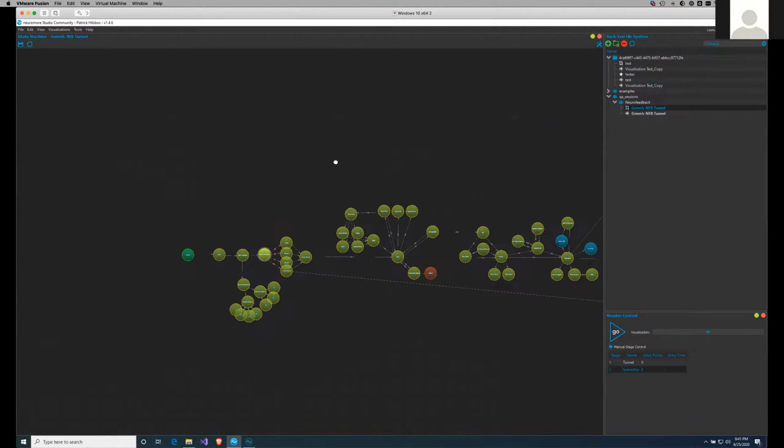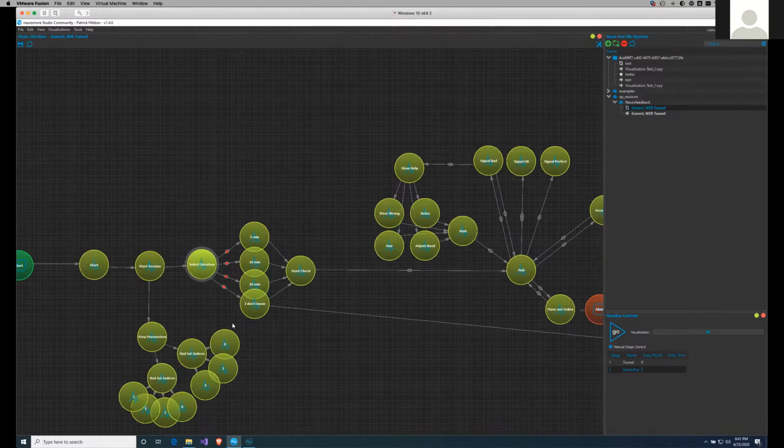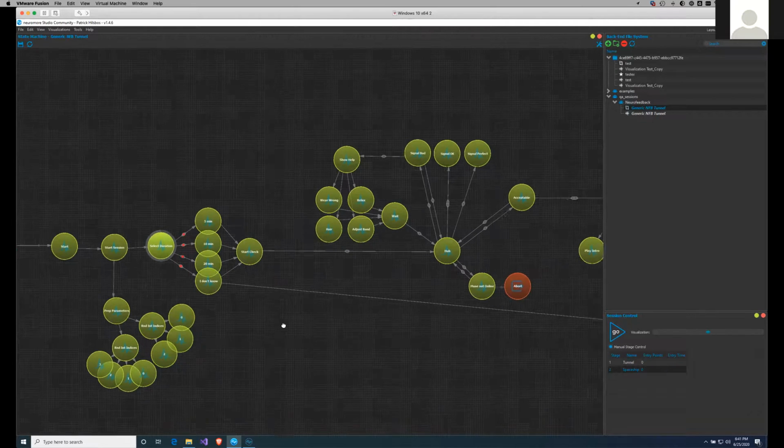So what we have here, state machine. The previous Q&A session was all about state machines, about what the states are, how to use it, how to set it up. So if you're new to the state machine, we highly recommend you check out the Q&A session about state machines. And that's kind of like a state machine that we created. What it does is set particular parameters within the classifier.